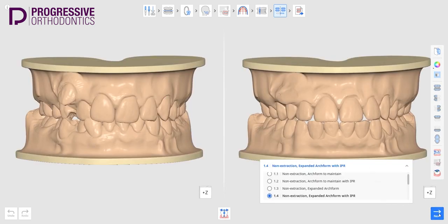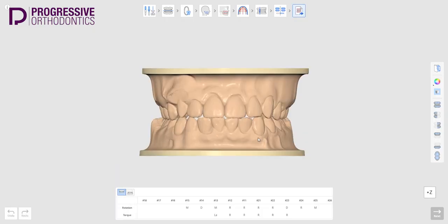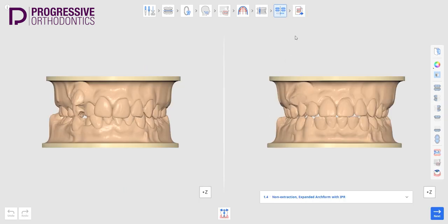We then choose between the available bracket or aligner treatment option. If the brackets option is chosen, the indicated appliance is sent to SmileStream, including arch wires, bands, and brackets with correct torque prescriptions as needed. A step-by-step treatment plan can also be generated.